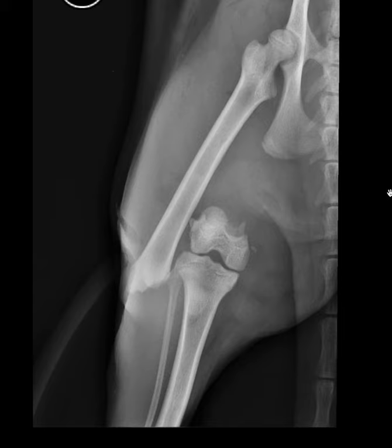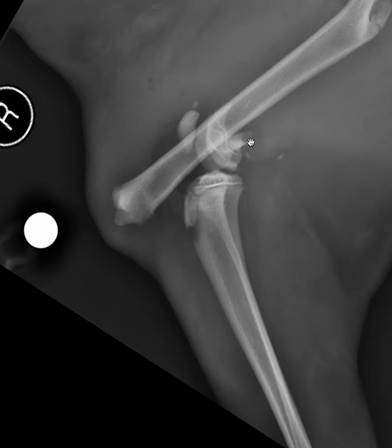The fracture type is the next thing that we would assess. Salter-Harris fractures have their own classification scheme. Essentially, when you have a fracture that goes right across the physis like this one, the next thing you want to look for is if there's any fracture extension up the metaphysis or towards the epiphysis. In this case, there's maybe a little bit of involvement, going back to the other view for a second, of the metaphysis. So we would call it a Salter-Harris 2.